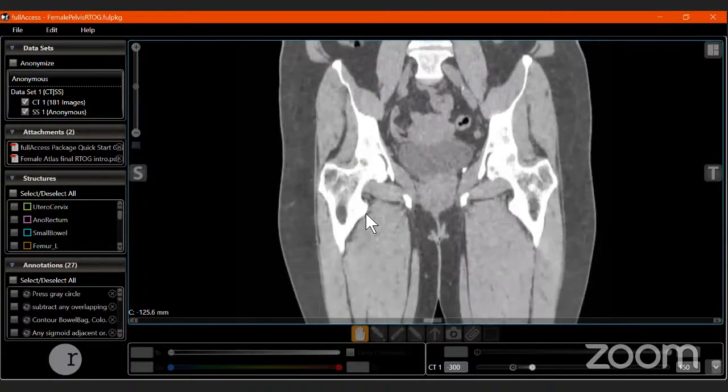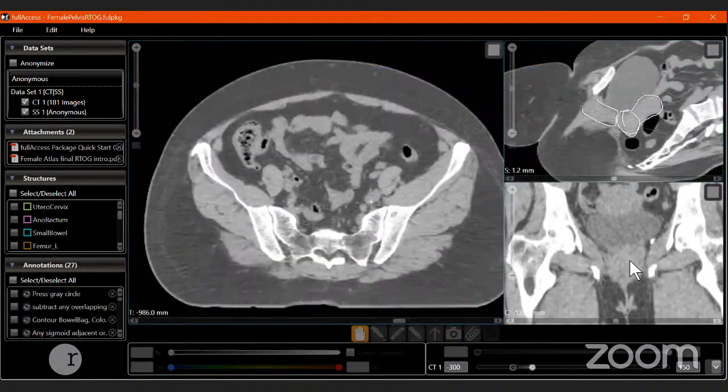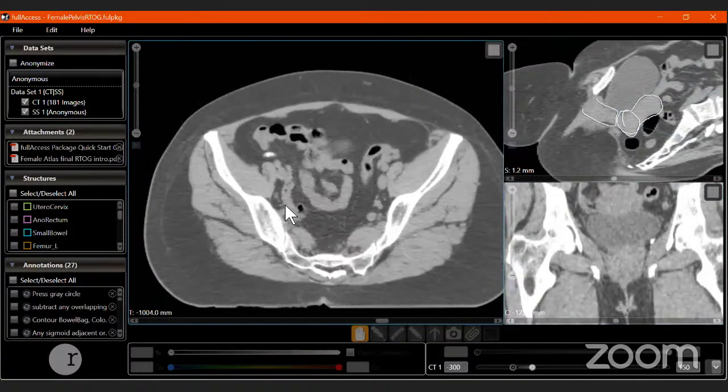This lesser trochanter is quite obvious. It's the poking thing you see, the medially emerging part of the bone. That is the lesser trochanter. We can stop right there. It's quite visible in a coronal or sagittal scan, though I think the coronal scan is much better. So when we go down in the axial scan, we can come down here.